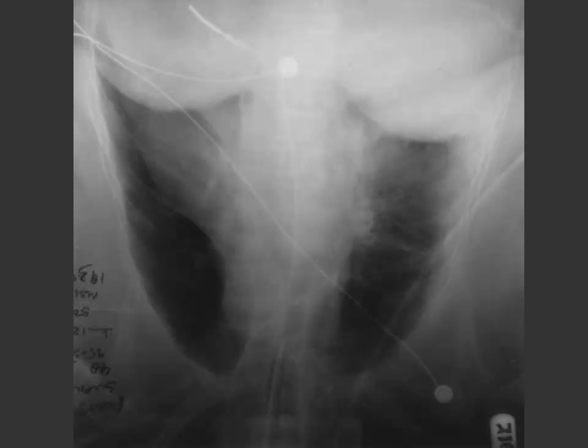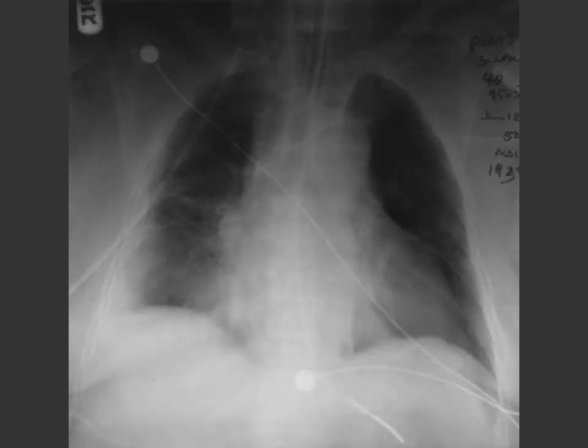Again, why is it important to stick to the rules? Try to read this chest x-ray. I'm sure you can. However, it will take you much more time than reading it in its usual orientation. The same rule applies for ultrasound images. You can interpret the image best when it's in its usual orientation. This allows for less confusion, and for familiar orientation to be to your advantage.